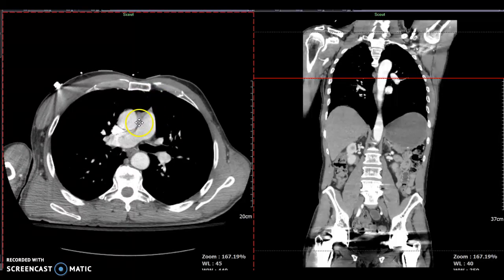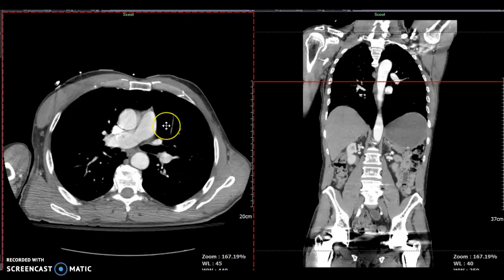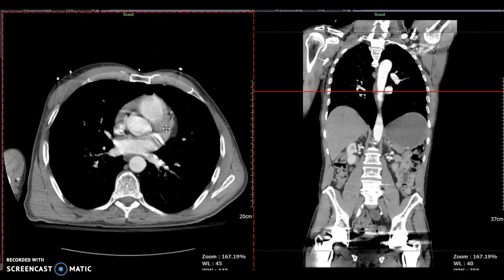Hello. Just a quick review of the chest anatomy that we went over a few weeks ago, last week, whatever it is, depends when you're looking at this video. This is just a quick review of the chest, and then I'm going to mainly focus on the abdomen.